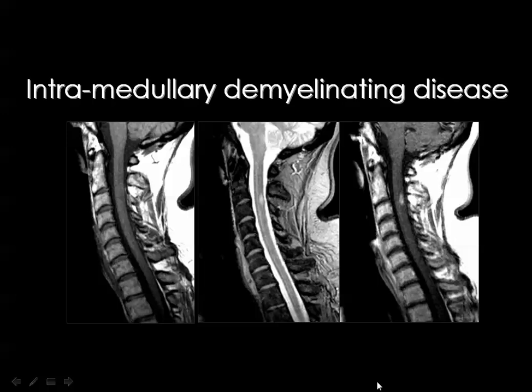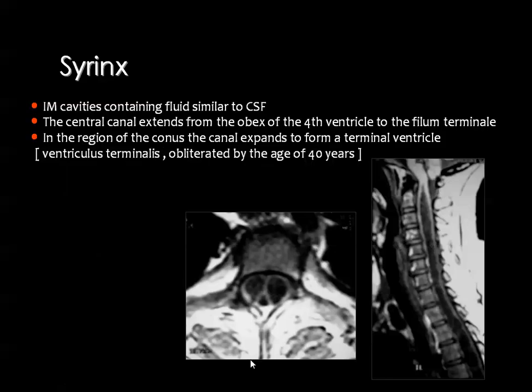You know that MS plaques can occur intracranially as well as in the substance of the spinal cord, and these MS plaques will show intermediate signal in the T1. They are not well appreciated in the T1. They are appreciated in the T2 weighted image, and if they show contrast enhancement, this indicates active disease.